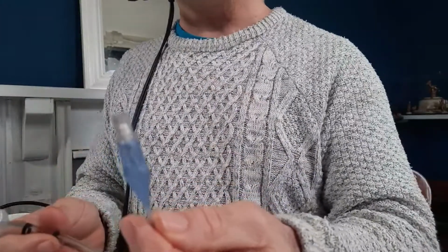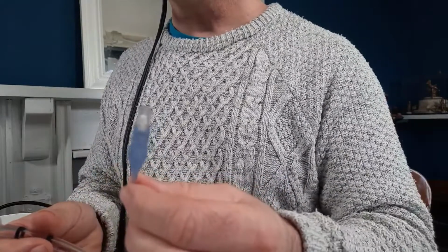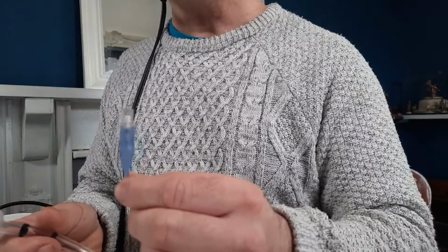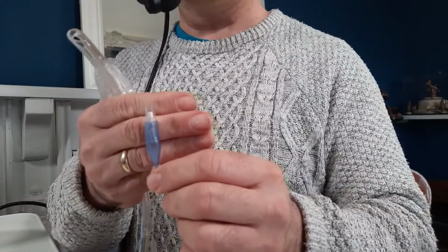So you need to inflate that balloon before we start the process, and you inflate that using the pilot balloon at the end. So that blue thing that's attached right at the end that you stick your syringe on, it's spring loaded, so you need to press in reasonably firmly and just inflate that balloon and make sure that there isn't a leak. We do get leaks occasionally with these, so we need to make sure that that is working appropriately.